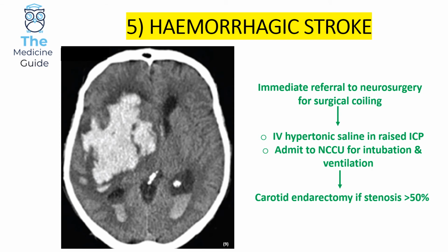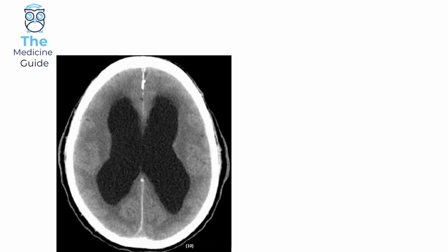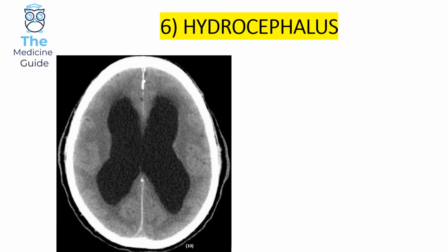Okay, so let's have a look at the next image. I'll give you 10 seconds for this. Hopefully this is nice and easy. Okay, so this is an example of a hydrocephalus.